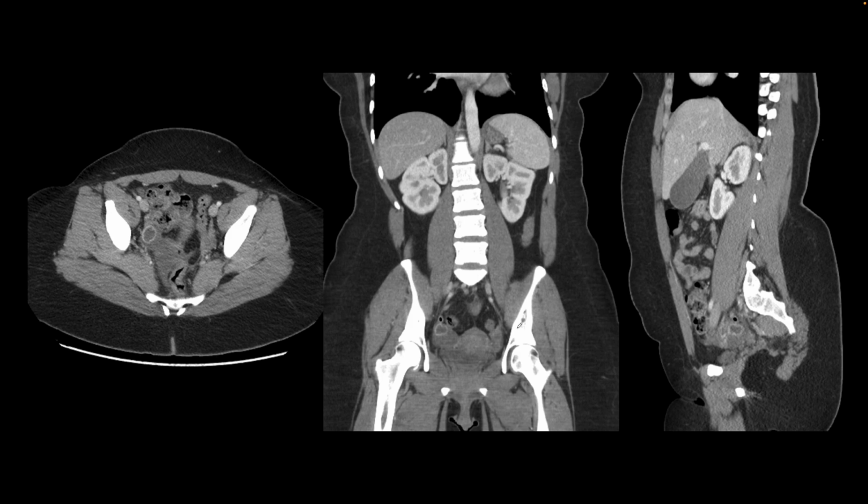Here is our next patient. They presented with abdominal pain, a young female, and we performed a CT of the abdomen and pelvis. In the pelvis, we see this corpus luteal cyst in the right ovary, and that has ruptured because we see some fluid around it. It's a common cause of abdominal pain in young females, the corpus luteal cyst rupture. Sometimes we are able to see a discontinuity in the wall of the corpus luteum. Sometimes there is hemoperitoneum, which could be life-threatening.